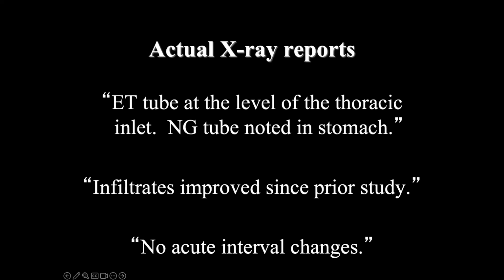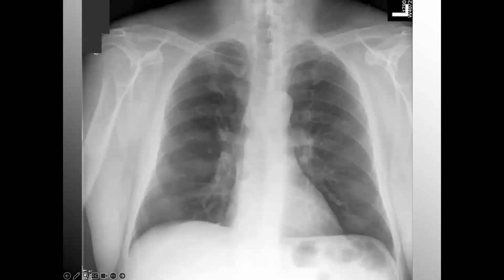Okay, so what are we looking at here? In particular, I can get my slide to change. There we go. Not everything is black and white, as I mentioned. Well, I guess technically on chest x-ray, it really is kind of black and white, but what's wrong with this picture? What's wrong with this patient, I would ask? Well, there's nothing wrong. This is most likely, even though it's not a full inspiratory film, this would be considered as near a normal chest x-ray as you're probably going to come across.